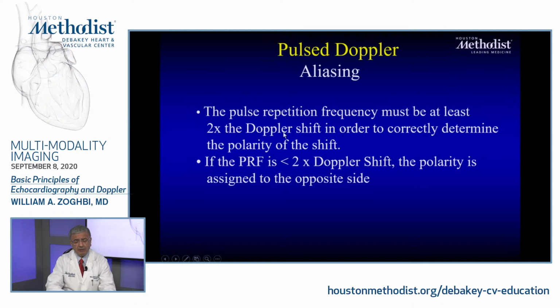Aliasing is the phenomenon where I cannot resolve what these velocities are, and they look like basically bands of frequency shift, and I really cannot tell what they are. And it depends on the pulse repetition frequency. It's almost like a stroboscopic thing. If you're in a nightclub and there's a moving object, you can't tell whether this individual is going in the right direction or opposite because you're seeing only a few pieces in time overall. Okay?